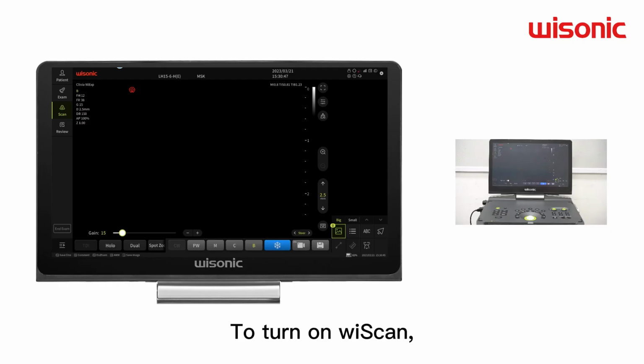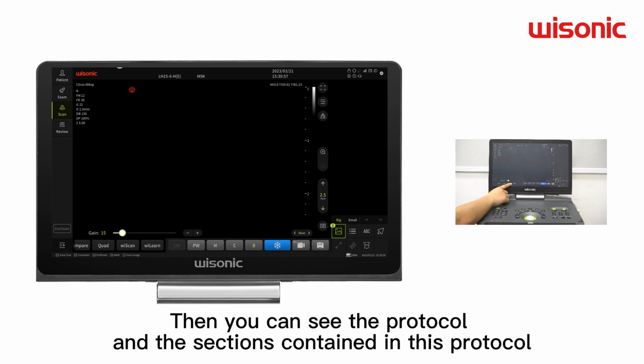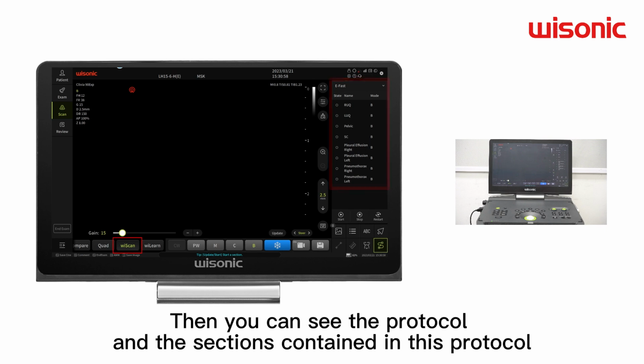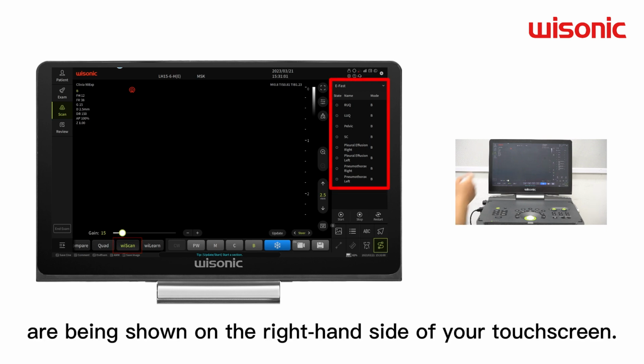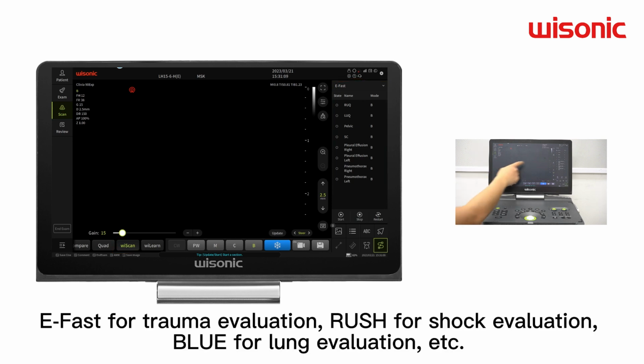To turn on wiScan, tap wiScan on the bottom side of your touchscreen. Then you can see the protocols, and the sections contained in each protocol are shown on the right-hand side of your touchscreen. For now, we have 5 protocols: eFast for trauma evaluation, RUSH for shock evaluation, BLUE for lung evaluation, etc.